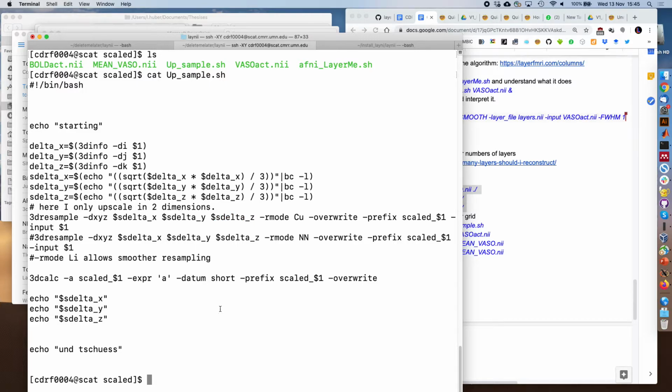So we have 15 more minutes, so let's quickly go to the upsample space. This just upsamples it, so let's execute it. Who's saying that we have only 15? Well, it was 4:30. Oh, she said 4:30. Okay. We have time. Okay.